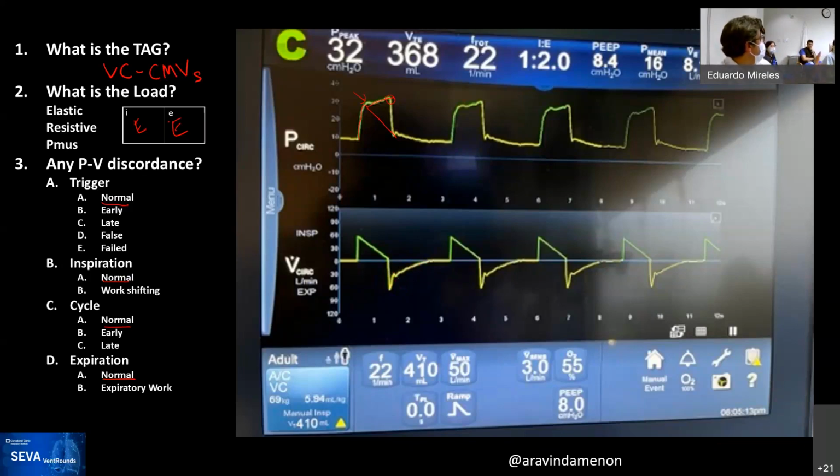Do we agree? Questions, disagreements, anger management? No. All righty. And then the second question that I have for you is, do you see any PMUS? Anybody see PMUS?